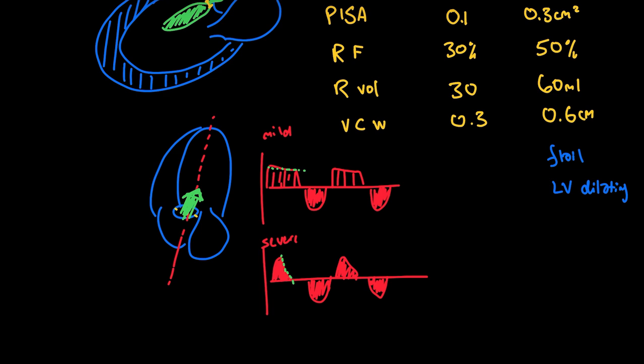So having a very flat line means that there's a persistent gradient and persistent trickle of flow, which is a good thing when we're talking about a regurgitant valve. So the flatter that line, the more likely you have mild aortic insufficiency. And if it's steep, and the tracing itself is very bright, that means you have rapid equalization of pressures, because you have lots of blood leaking back all of a sudden from the aorta back into the left ventricle.